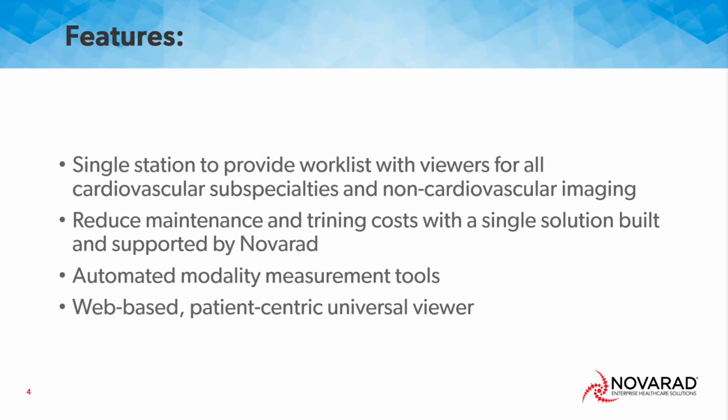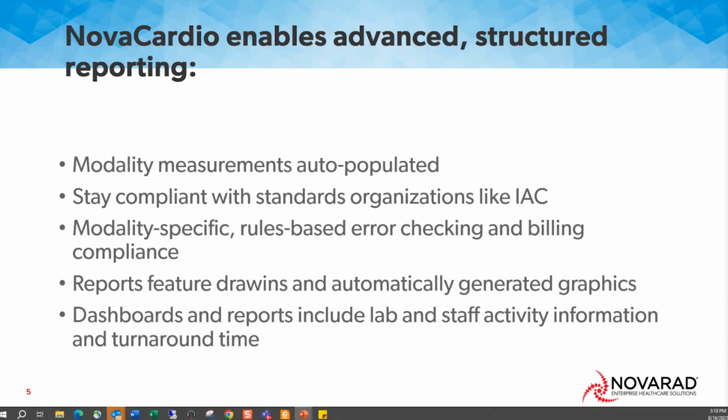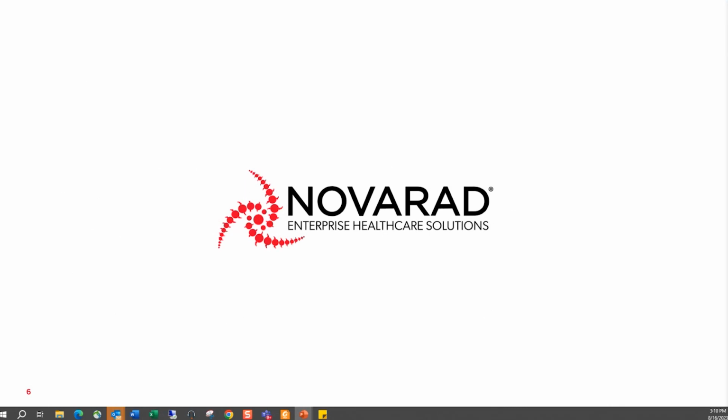Automated modality measurement tools, a web-based patient-centric universal viewer, and NovaCardio enables advanced structured reporting. Modality measurements are auto-populated, stay compliant with standard organizations like IAC, modality-specific rules-based error checking and billing compliance. Reports features drawings and automatically generated graphics. So that's drawings, my G is missing. Dashboards and reports include lab and staff activity, information, and turnaround time. And that's the end of the intro.